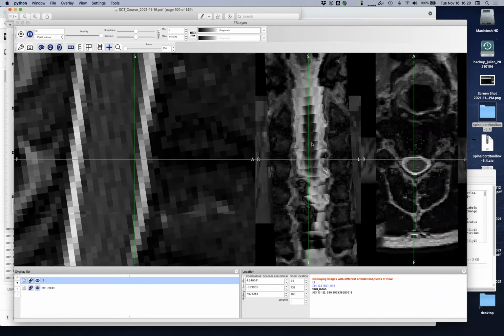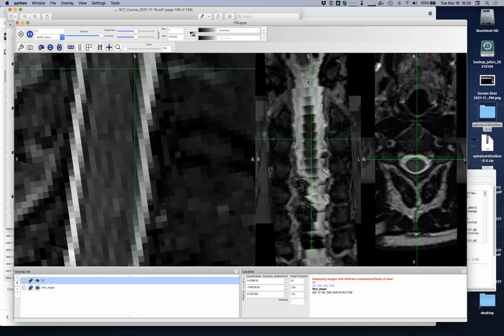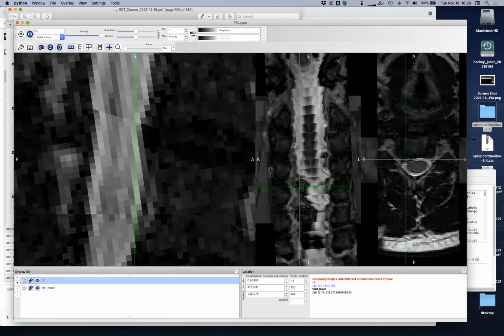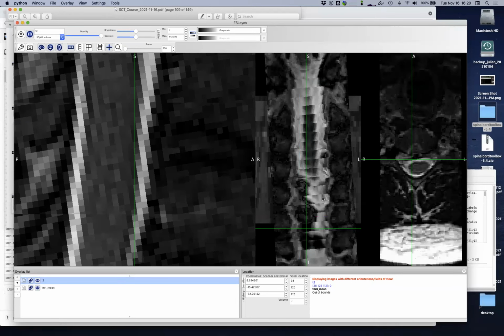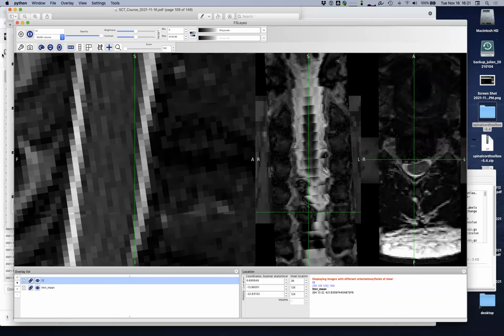And so what you can see is if I'm toggling the T2 on the fMRI, they are kind of registered, but not so well, right? And there was no registration here. I'm just taking these two images, which were acquired during the same session. The participant did not move too much, and that's reasonably good. Again, there are minimal distortions and so on.